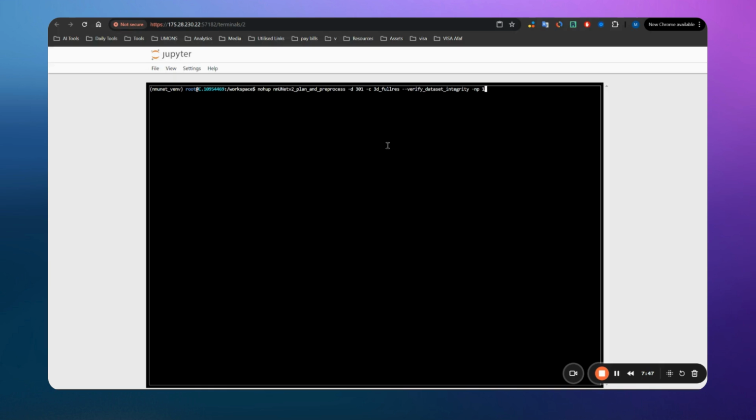Because you can train your model now, and maybe whenever you get more data, you want to just refine your model. You don't want to change the architecture or any pre-processed argument. So in this case, you need to make them constant and just fine tune the model on the new larger data set. You need to make sure that the parameters that can be changed in the plan and pre-process and in the training also stay constant.